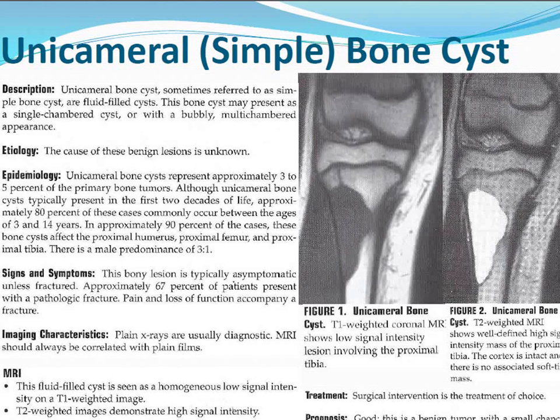on MRI. And these ones, sometimes, if they're big enough like this one, are at risk for fracture, even if the patient doesn't have pain or doesn't have a fracture at this time. They'll put some bone graft, pack it in with some bone so that it grows in and fills in. The cyst becomes more like a normal bone, able to support the weight and everything like that. But it's a benign lesion, no risks after you take care of the risk of break.